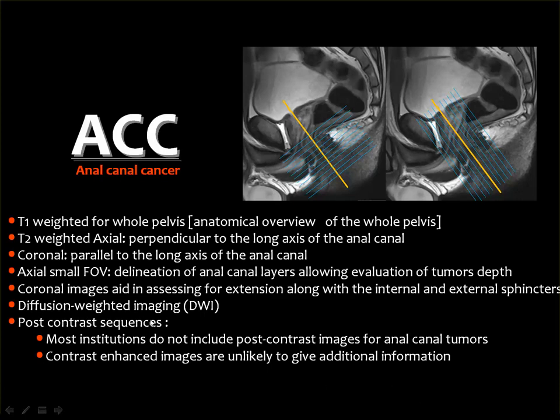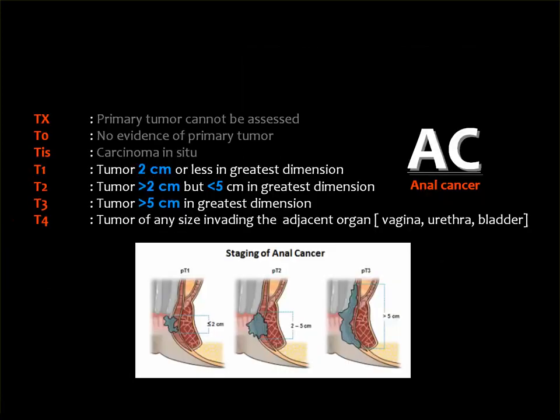Sometimes we may use the diffusion weighted images for evaluation of the anal cancer, and many of the literature do not favor the use of contrast material in evaluation of anal tumors, since they are convinced that contrast enhanced images are unlikely to give additional information, and this is relatively right, and you'll see this in the coming cases.